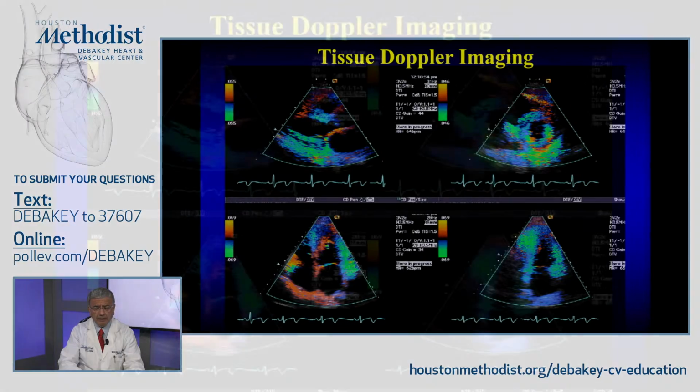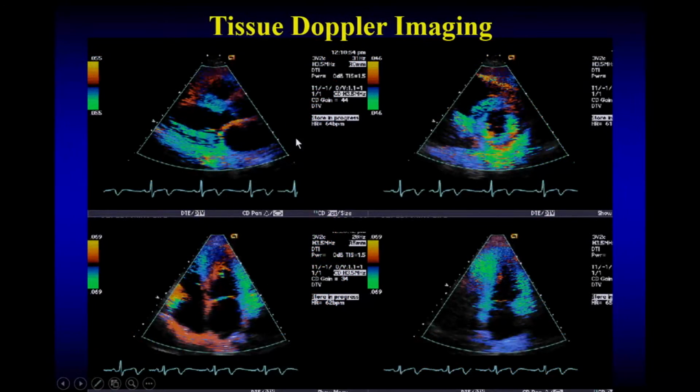Tissue Doppler, a signal that we've ignored for many, many years now. We've had it, I guess, 15 plus years now. We ignored it because it was more of a noise thing, and we were much more interested in the Doppler and the velocities of the red cells themselves in the ventricle, but it turned out that there's a lot of information in that. Interestingly enough, you can differentiate them very nicely. Why? Because the velocity in the myocardium is much lower than that of blood flow itself, and also the intensity of the signal is much higher.